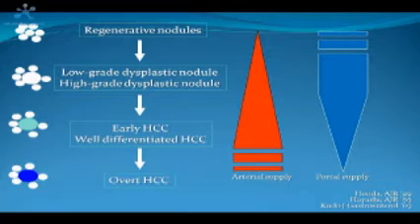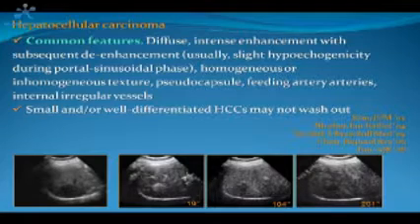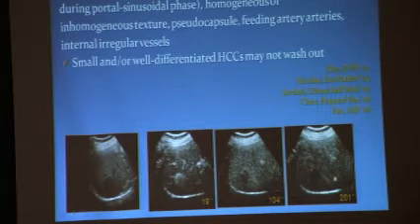As you know, along the way to overt hepatocellular carcinoma, there is an increase in the arterial supply and the loss of the portal venous feeding of the lesion, and this is reflected, of course, in the perfusional model of HCC, which usually shows a strong diffuse enhancement in the arterial phase, as you can see in this image, and with a rather slow and not so strong washout.